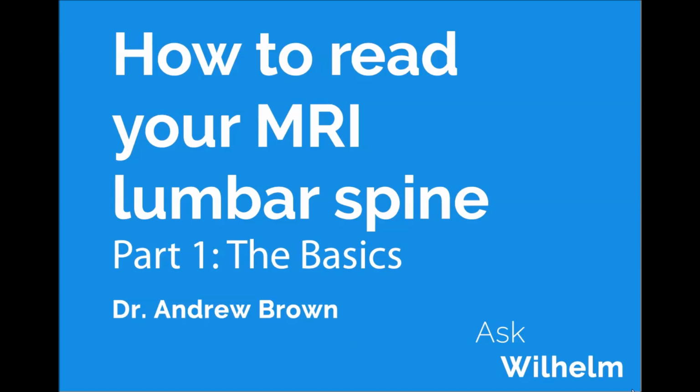I'm Dr. Andrew Brown. This series of videos is intended to help you understand what we as doctors are looking for when we review these images. I hope these videos will empower patients to have more informed conversations with their care team. These videos should be used for educational purposes and not for diagnosis.